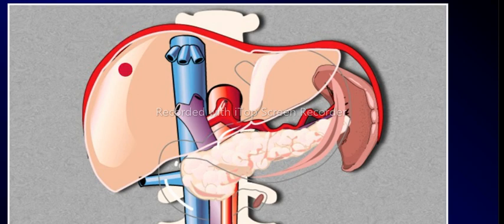And then down here, where we have formation of the IVC, this is the inferior vena cava, this tubular structure here. It's formed by the union of the common iliac veins. These are branches of the renal arteries there, obscured. And then this here is the superior mesenteric vein, this is the superior mesenteric artery, and behind it we have the abdominal aorta. Then the white structure behind there is the spine, and these are the transverse processes. Again, this is your diaphragm, the red. This is the left hemidiaphragm, this is the right hemidiaphragm.